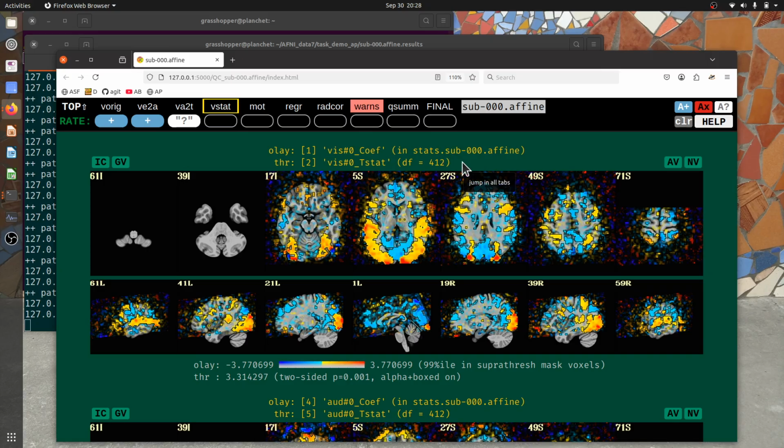But in papers, the thresholding is often done differently, even though we hope to change that and persuade people to do more informative results reporting. But this is also just a single subject. We know fMRI data is noisy, and this gives us a sense and a reminder of it. And we're looking really to see if there's structure out here. Otherwise, just these random high and low points are fine.